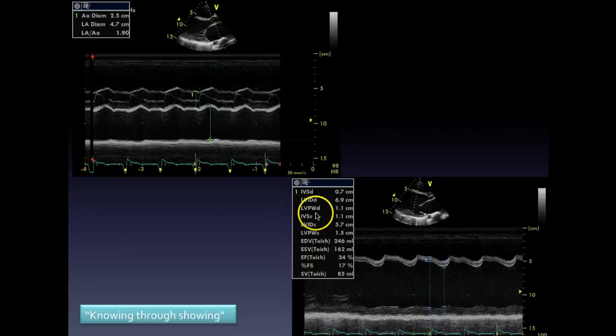The ejection fraction based on fractional shortening here is 34%. I don't believe it's 34%. The end diastolic volume based on the geometric assumptions we were talking about earlier is 246 cc's. Now remember we said the normal left ventricular end diastolic volume in a 5'10", 70 kilogram male, of which this guy is, should be 120. So I actually think that's probably not a bad estimate in this guy. I guess his ventricle is twice the normal size.